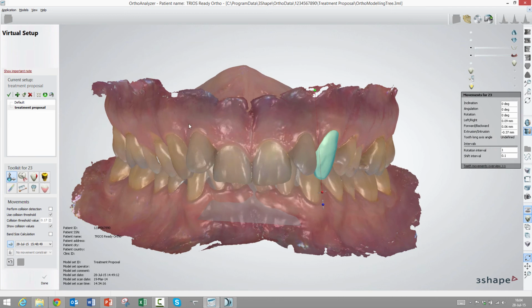So as Henrik has mentioned, we have this model set concept that will be, if I use this export feature, because it will populate the patient browser. Right, because right now I would not be able to see from the patient browser what you've just done. Exactly, unless you do this. So it's quite important to do this if you want to do treatment monitoring. For example, if you have a patient you want to follow during the treatment, you have made a treatment plan and you want to make sure we're on the right track. Well, this would be the way to do it.